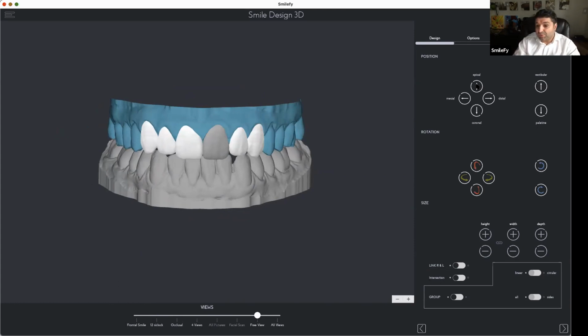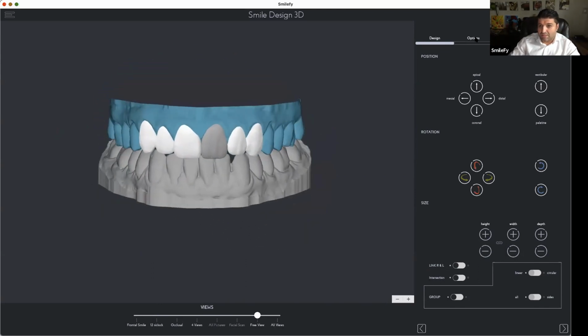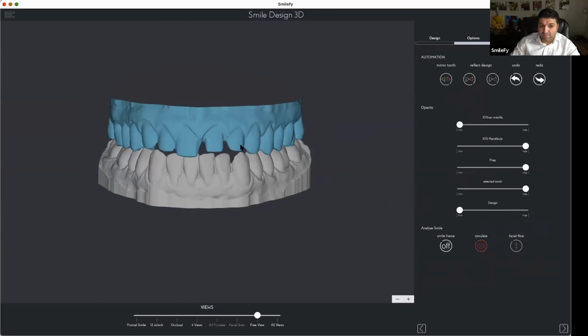We're gonna find a super easy way to create a digital prep. The form of the prep is actually not important, because if you create the design in an ideal way, the veneers and all the rest, then you can see if ideally it works or not, and then you can adjust your treatment and your plan accordingly. Digital prep, design over the digital prep.